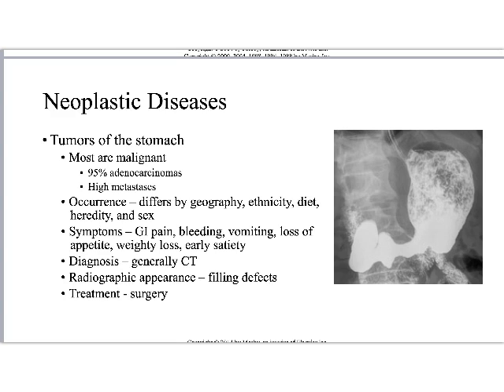Generally, it's diagnosed incidentally on CT, right? Incidentally means, oh my gosh, this person's got a cancer on their stomach, right? The radiographic appearance is just filling defects. So in this case, we have what sometimes is called an apple core sign, right? You can see the barium has hit the pyloric area and just kind of funneled down. It's not quite a string sign, but it looks like an apple core right here. What's around that apple core is the tumor. The tumor is wrapped around the entire stomach. We're not able to see the tumor on this image, but we can see the effects of it.